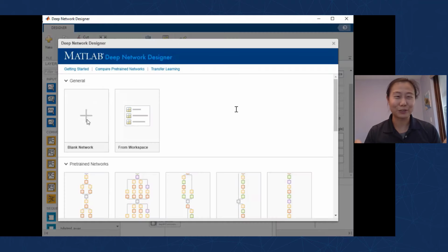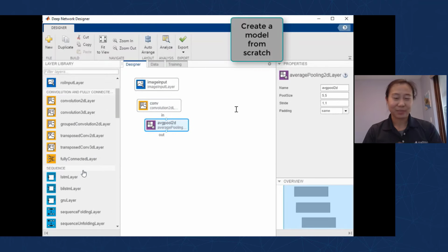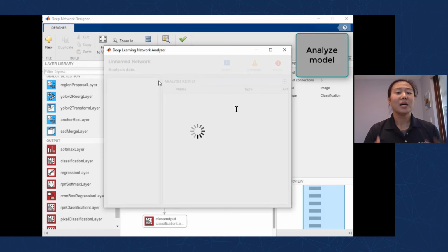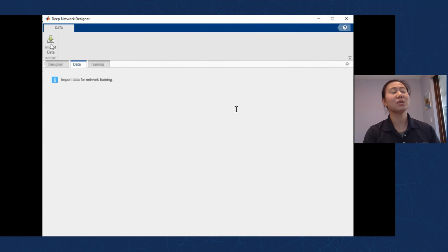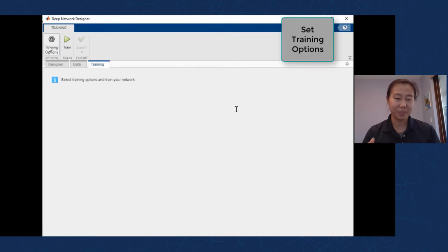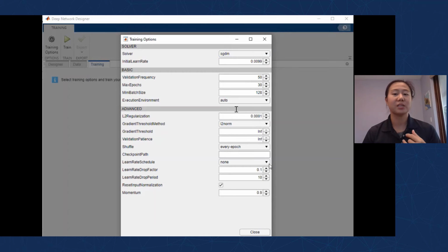You can be an artificial neural surgeon for a day, put together a network, connect them all up, and do some pretty neat analysis. Additionally, you not only can design your neural network in this app, but you can also take it through the entire task of training. You can point to a data folder, have all of that data loaded up, as you can see here, and perform the training, including sending the training to a cloud cluster of workers or GPUs.